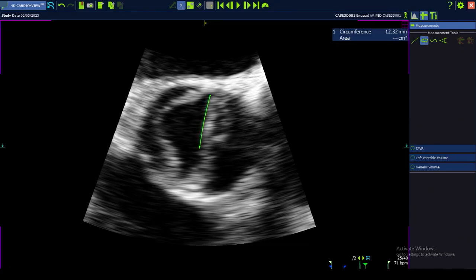Okay, so you're just clicking. This is a connect the dots thing. So I'm just clicking, clicking, clicking, trying to follow the valve orifice. So I have a valve area of about 1. Anyone have something similar to that, hopefully? Around 1-ish. We're all going to be somewhere in that range. Any questions on how to do this, how we got this, how to measure valve areas?